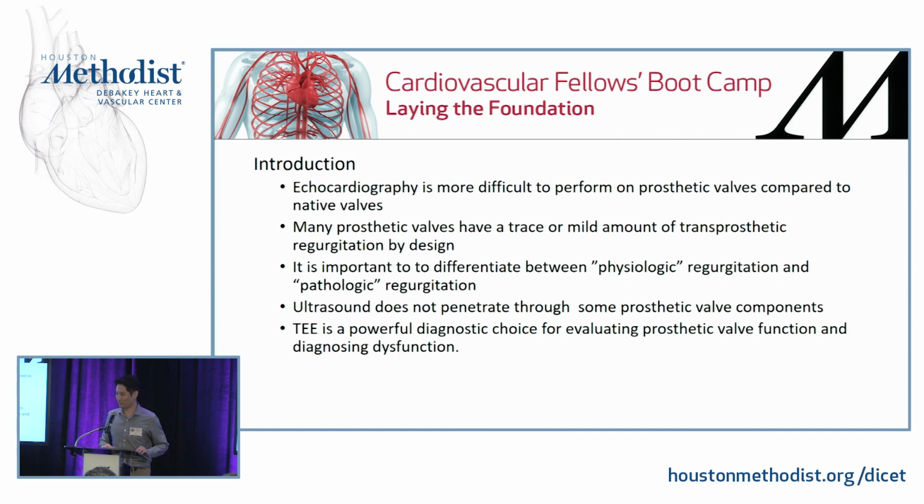Echocardiography is more difficult to perform on prosthetic valves versus native valves because there are artificial components of prosthetic valves that ultrasound may not penetrate. By design, a lot of these valves also have regurgitation, and it's important to differentiate what's normal and what's abnormal. TEE is a very powerful diagnostic tool for prosthetic valves.